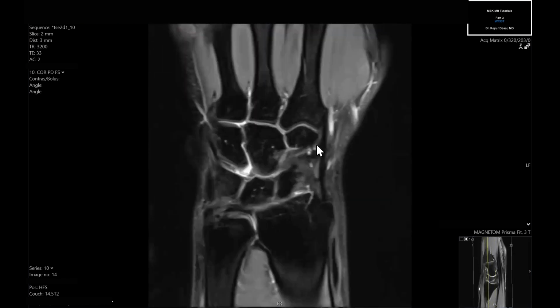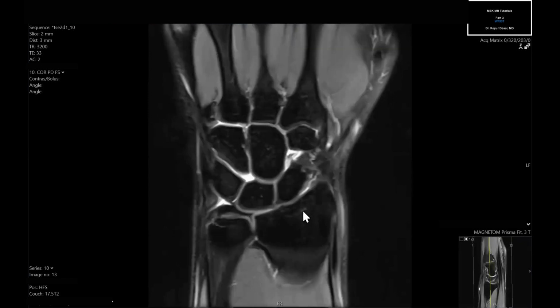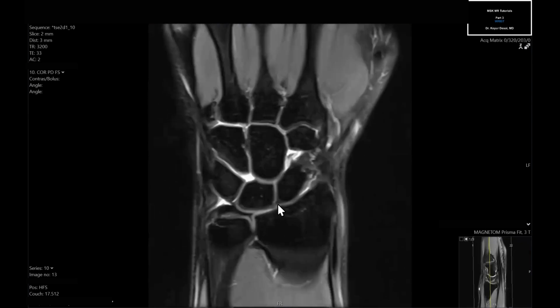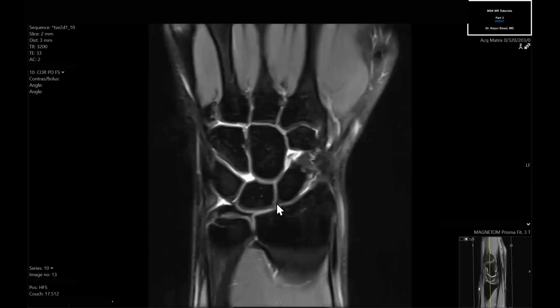And then after that, I'll start to run through a lot of the soft tissue structures of the wrist. The first of those being the scapholunate ligament. So this is a ligament that's technically going to have a more volar, a more central, and a more dorsal portion, depending on how the MR turns out. A lot of times I feel like it is difficult to denote one component from the other different components. So a lot of times I just lump it together as one discrete structure.